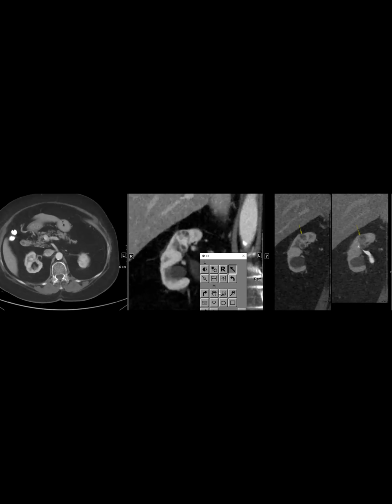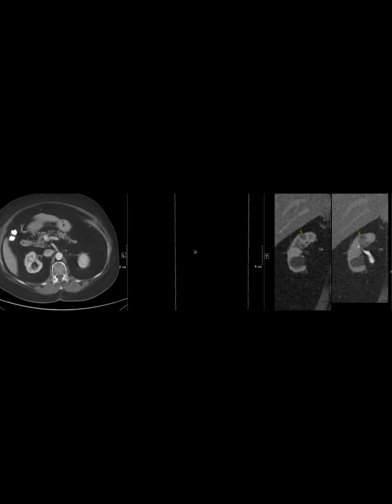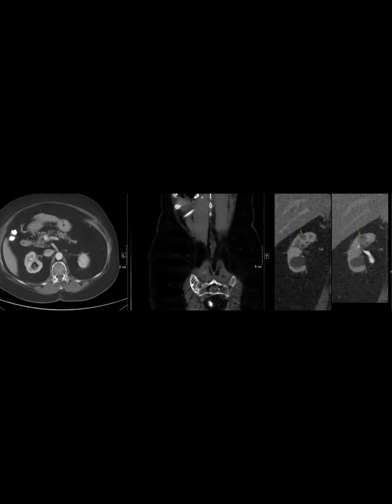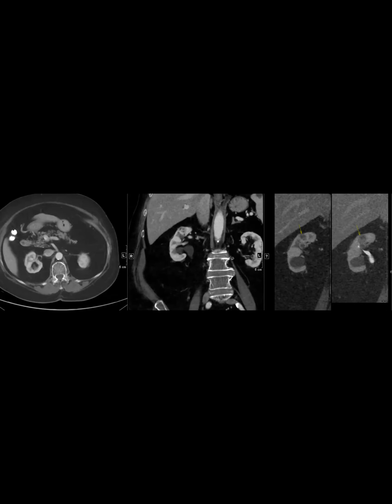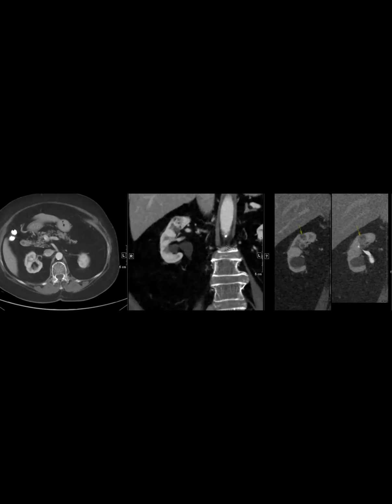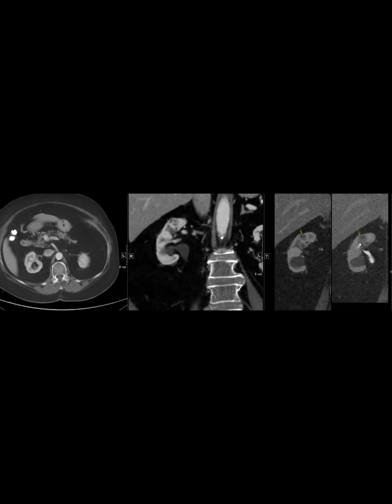Anyway, so what do you know? Anybody have any thoughts about what the differential is? Okay. I don't see gross fat. Do I? No, there was no gross fat. Arwa is saying clear cell. Right. So we're thinking about either clear cell or some sort of cystic and solid mass. There's one thing here that, once I tell you the diagnosis, you're like, oh, cool.